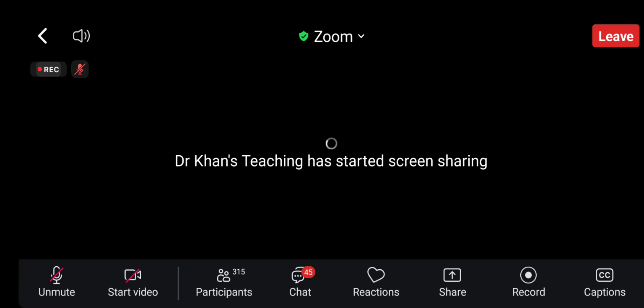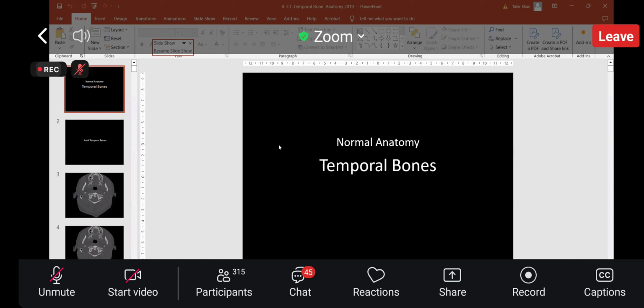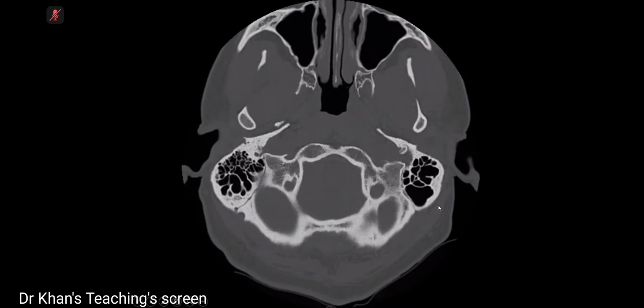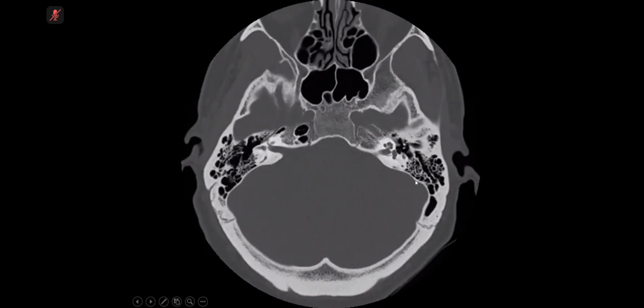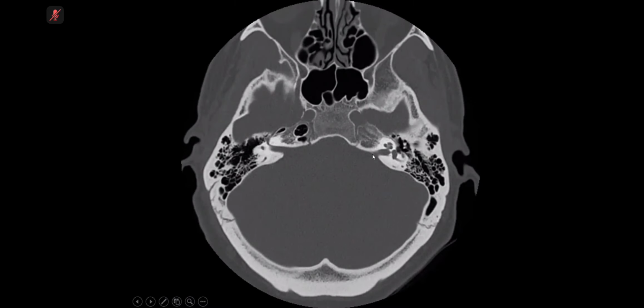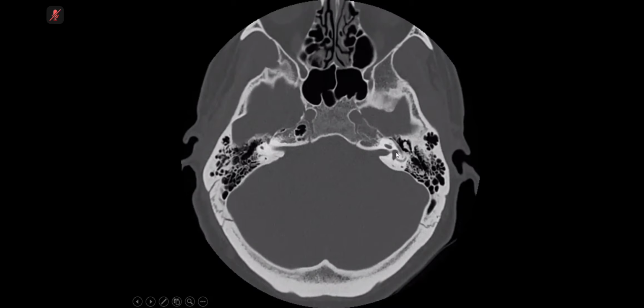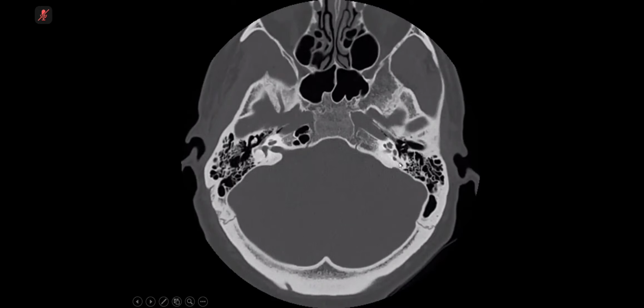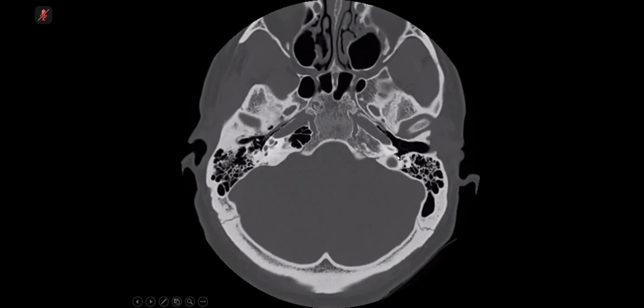just quickly the bony anatomy of the labyrinthine portion. So I am just showing you an axial CT scan, and we don't have time to go through everything, but just concentrate on this. Now you remember this is the cochlea. I call it the flower because it looks like a flower. And so the cochlear nerve, you can imagine that this is the IAM, and this is the vestibule. And then we have got the lateral semicircular canal and the posterior and the superior, which is this one.